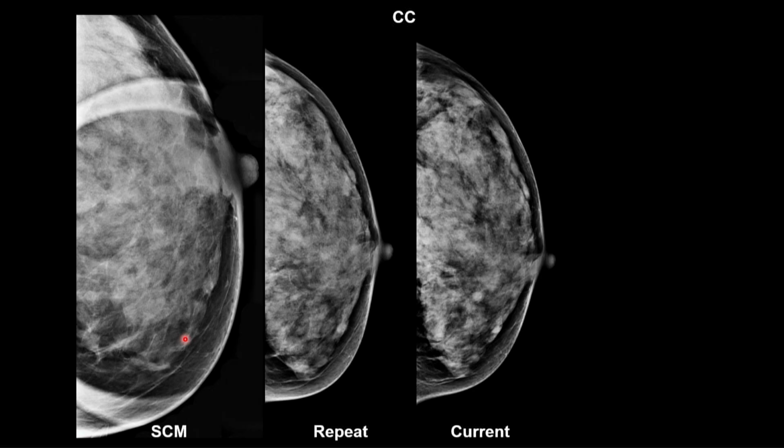Well, what does this mean? In my experience, I can't speak for my colleagues because I'm not there while they read, but in my experience, having done this thousands of times, every instance where I don't see it on those two images, it's a superimposition. It's definitely not a breast cancer. So this is a 100% reliable way of establishing superimposition if you recall a patient. It's not the only way.